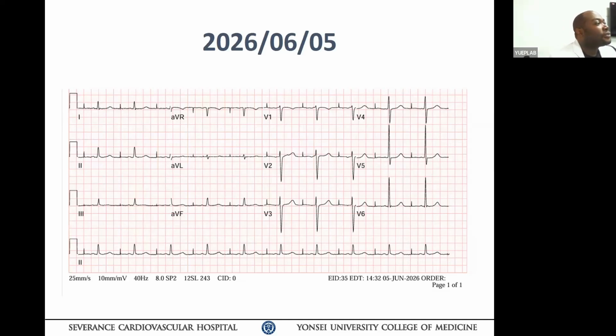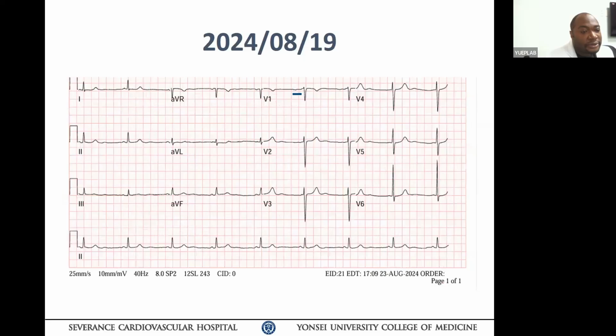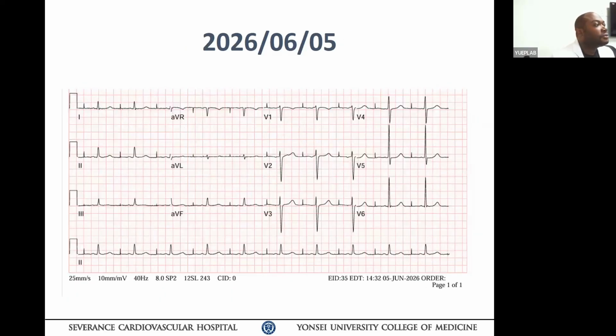So the P wave amplitude is progressively reduced. The second consideration is that the interatrial conduction delay is gigantic in this patient. It's not just capture delay, the interatrial conduction is also long. If you look at lead 2, how do you determine the interatrial conduction delay? Because your P wave is already separated out. By duration, yes. So a long duration, but also the vector.